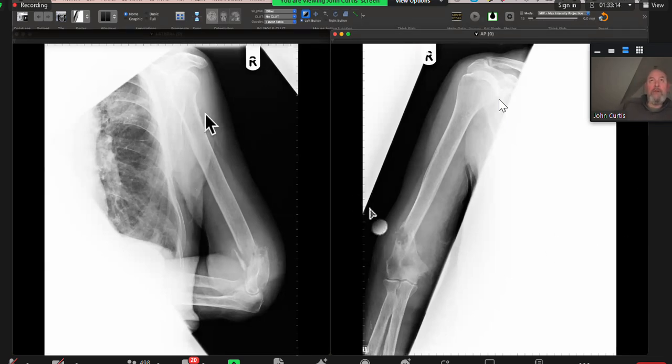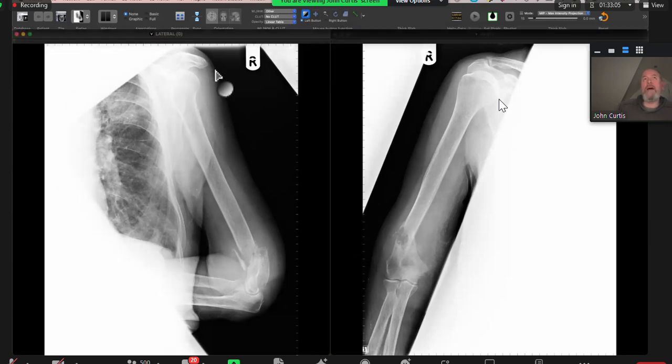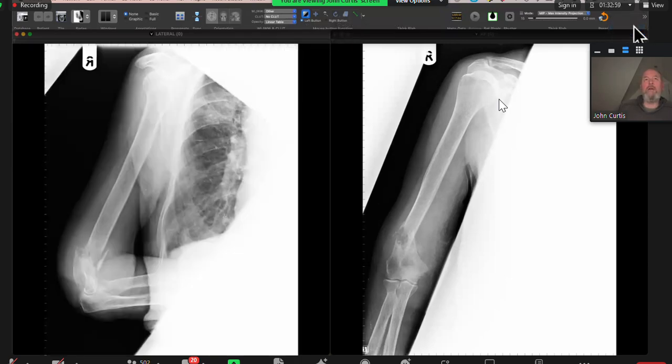So this is, I'll take the controls if that's okay. Yes, sir. Okay, thanks. So don't touch the mouse. That's it. Great. So I can flip that horizontally. There you go. So it's right. There's the lesion. So pathological fracture.